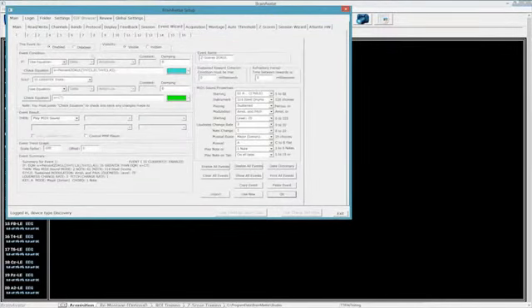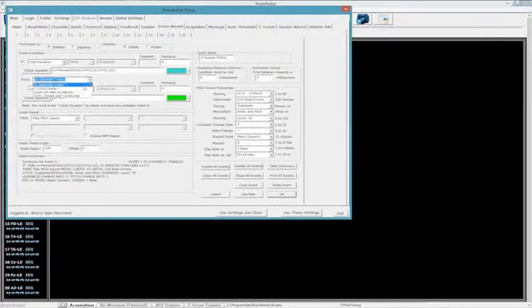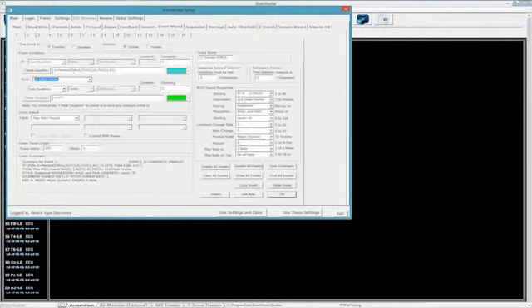And then we're saying is rule, is greater than or, and there are other ones. I would only worry about is greater than or is less than. So here we go. Is greater than, go. Is less than, stop. There it is. So right now we're not doing much differently. And then greater than, and right now we have use equation x equals CT.